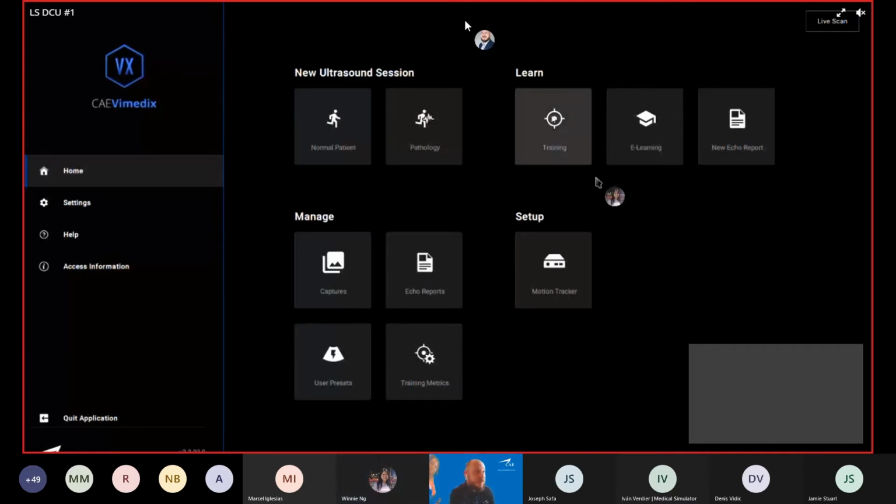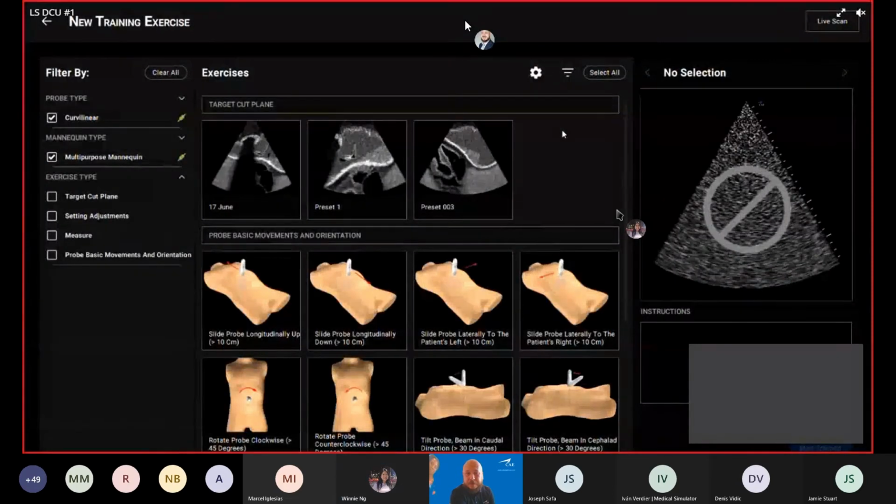So now when you click on training, okay. Let's say, Eric, we're trying to make a scenario. Let's say I'm actually based in Malaysia, and Eric is actually based in Poland, and we want to study the same pathologies or discuss the pathologies together.